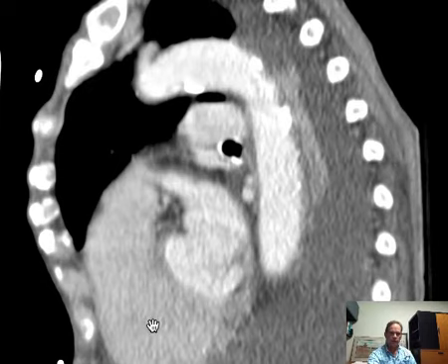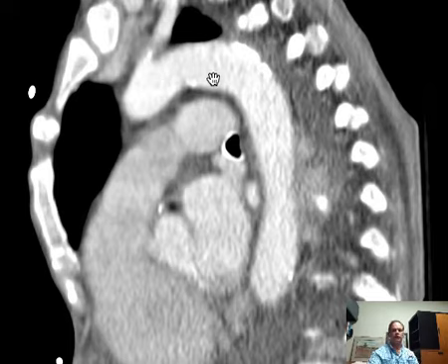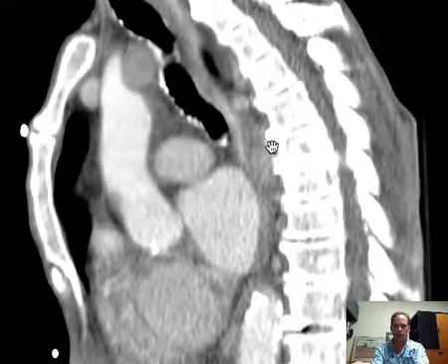So here we have the right ventricle. It looks a little different because of the phase of the injection. So the densely contrast-enhanced blood is in the aorta, and it hasn't quite yet gotten around through all of the organs and come back to allow the main pulmonary artery to look very, very dense like this, and the aorta to have a more washed out appearance.